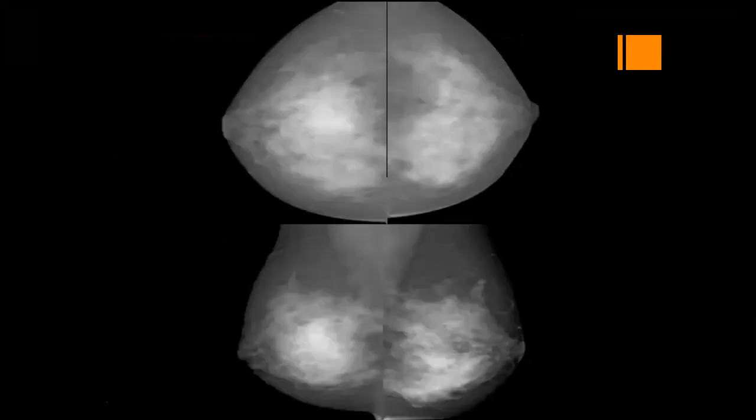What about this? How are you going to report this? Would like to go a little bit quickly. Where is the abnormality? In which side?